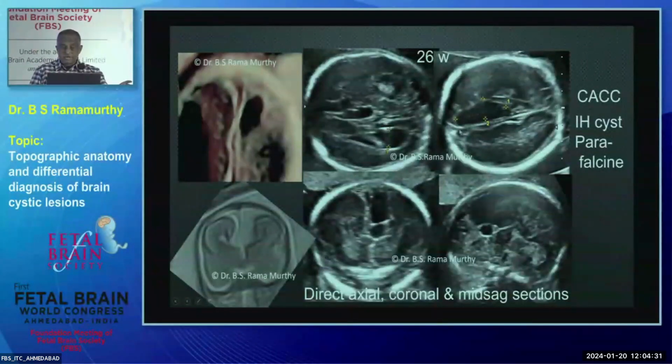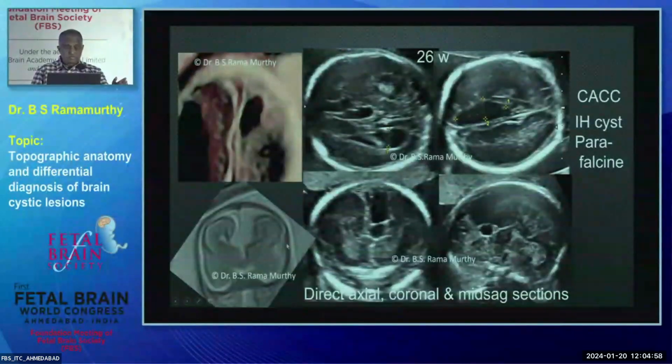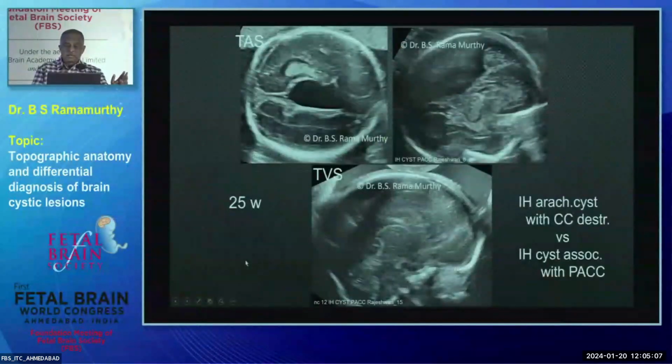This is the falx cerebri. It is in the interhemispheric fissure. So do your extended sonogram, you find that the fissure is here and your cyst is on one side, so it's the parafalcine sign. It is an interhemispheric cyst. On your mid-sagittal section, you see the cyst, and what is missing? You see the vermis, but what is missing? Corpus callosum. That's your MR support over here, and you find the cyst is communicating with the third ventricle, right? So that's an interhemispheric cyst in a case of complete agenesis of corpus callosum, extraaxial, in midline, supratentorial.